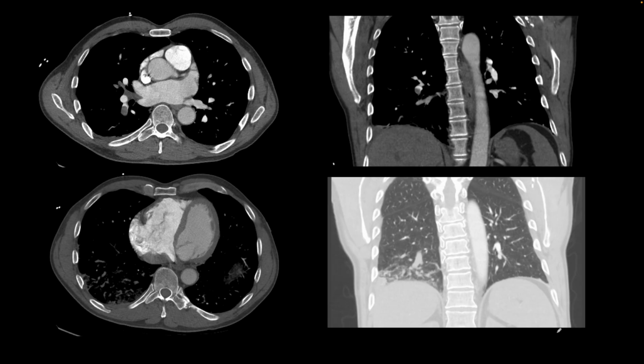So let's start with an example of acute pulmonary embolism, a positive study, where there is a filling defect in one of the right lower lobe pulmonary artery branches, also seen here on the coronal projection, and there are some findings in the lung windows in the supplied portion of the lung showing developing pulmonary infarct. This patient also has right heart strain. We see that the width of the right ventricle is more than the width of the left ventricle. So this study is positive for PE, developing infarct in the right lower lobe, and right heart strain. This is what we look for in a positive study.